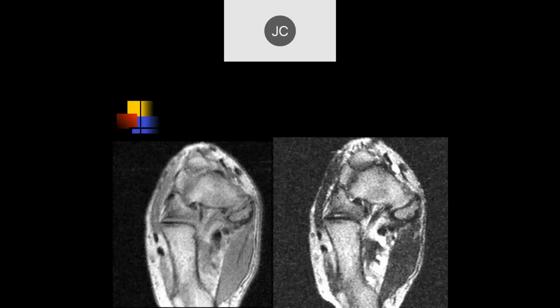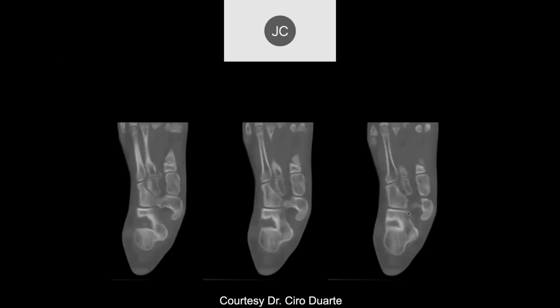This is the navicular, cuboid. So there is calcaneus. Looks like an accessory navicular or something. So it's a type 2, there's an ossicle here. Yeah, type 2. This is actually the distal end of the posterior tibialis tendon, and that's accessory navicular. If we were type 2, I guess we're going to go through these now, even though we'll talk about it again when we get to tendons and talk about the PTT tendon.